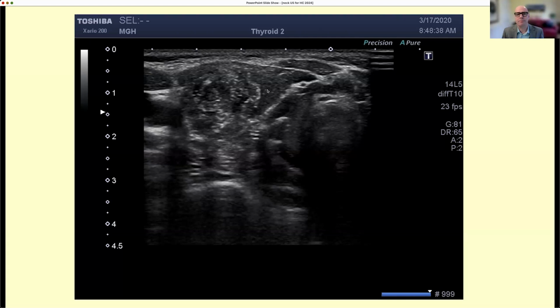They have a hypoechoic pattern, but within it, there are a lot of bright reflectors, and these could be calcifications. And what kind of thyroid cancer do you see in the context of Hashimoto's thyroiditis in a young person with a lot of calcifications or psammoma bodies?